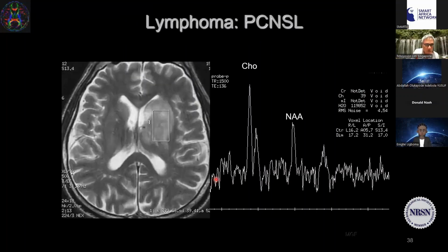So we had a patient who had a basal ganglion enhancing lesion that was initially treated with toxoplasma medication. Unfortunately, it did not get better. The lesions remained the same. They didn't get smaller or disappear. So we were very suspicious if this could be differential diagnosis of lymphoma.